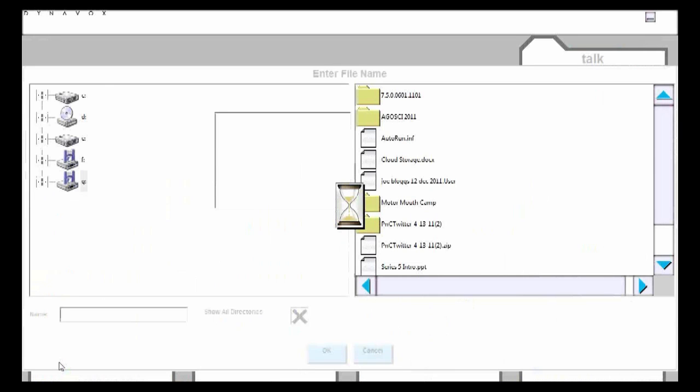That may take a little bit of time depending on how many pages you're backing up and how many modifications you've done. You'll see that hourglass come up as it's doing the backup, and then once that's gone, you might get a quick message that says backup was completed successfully.